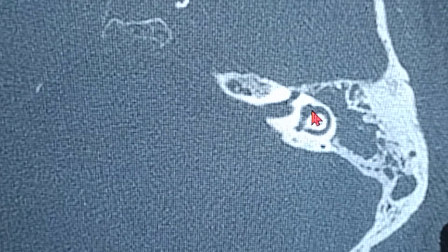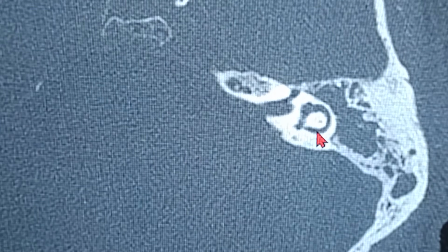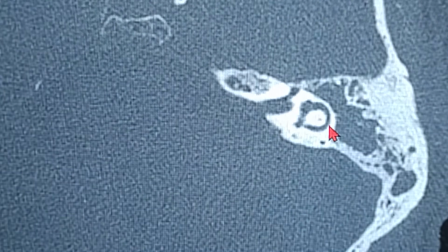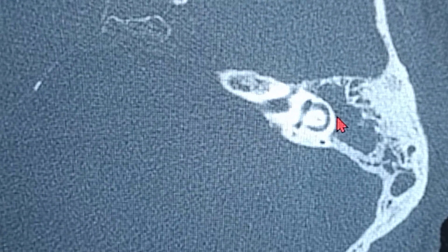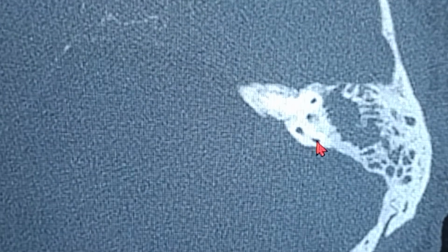That's the lateral semicircular canal. So if you're not able to see the facial canal because of the excess disease on a particular side, you just have to expose the lateral semicircular canal, and below that lateral semicircular canal you can see the facial nerve passing through. That's the lateral, that's the superior semicircular canal, that's the posterior semicircular canal right there, and that's the posterior right there. You can see that's the posterior canal.